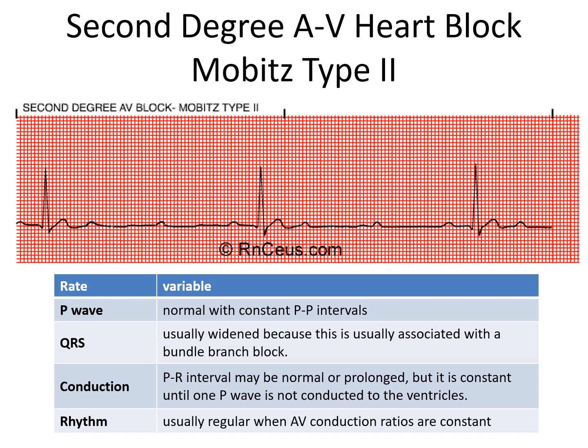Okay, let's see if there's anything we didn't mention down there. Okay, so you see a P wave did not result in a ventricular contraction. This one did. All the PR intervals, if you measure them, the ones that have a Q, if you measure those, they're all the same. They happen to be prolonged, but they're all the same. No increasing it in length.